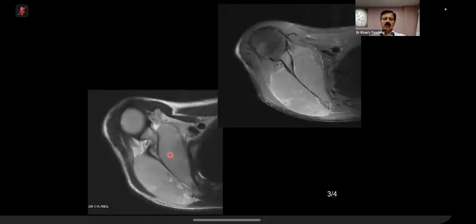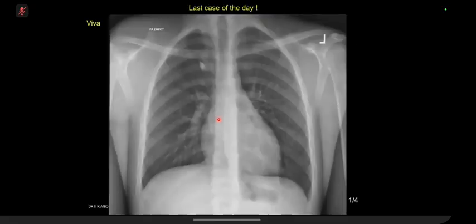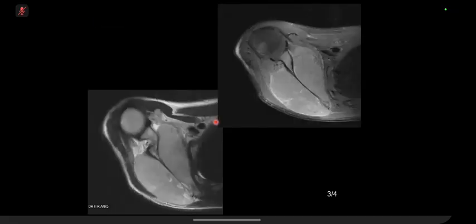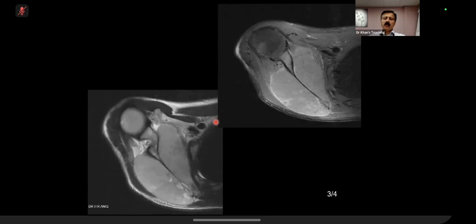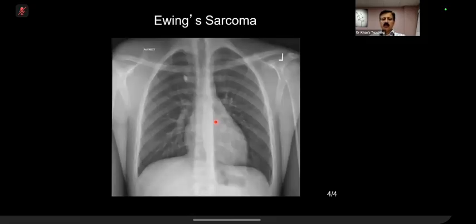And on MR, you can see a lot of soft tissue. What is your conclusion with this MR? Soft tissue, so much soft tissue with the tumor. So it could be a liposarcoma. Why do you say liposarcoma? There's a large soft tissue component. I suppose, yes, given large soft tissue components, Ewing's, if the age, because Ewing's can be up to 30 at times. And of course, lymphoma should be up there. Lymphoma, right? This was Ewing's.